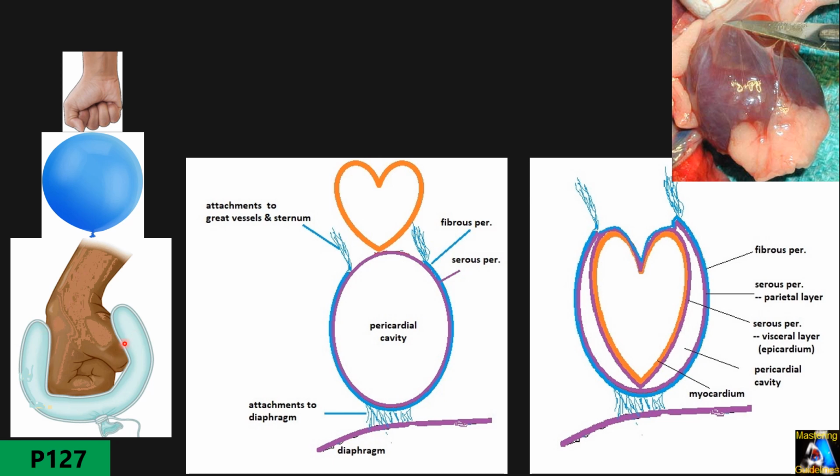So in this case, you can see here, we still have a pericardial space there, and we have some dead end or returning of the wall here between those fingers and groove, so it creates some kind of recesses, sinuses, or cul-de-sac that shortly I am going to explain.